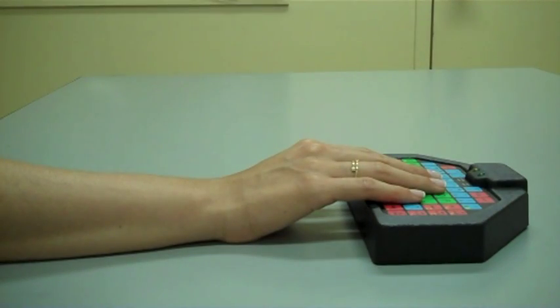As seen in the standard keyboard, the forearm remains pronated and the wrist remains in extension. On the other hand, the mini keyboard has eliminated ulnar deviation, excessive MCP flexion, hyperextension of the second digit, and hyperabduction of the fifth digit.